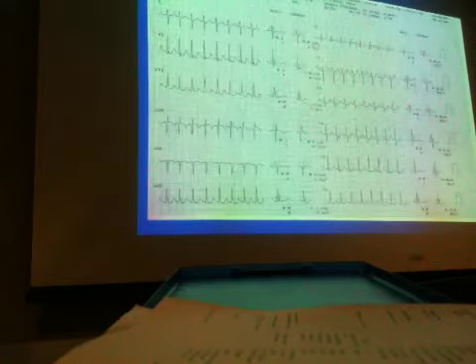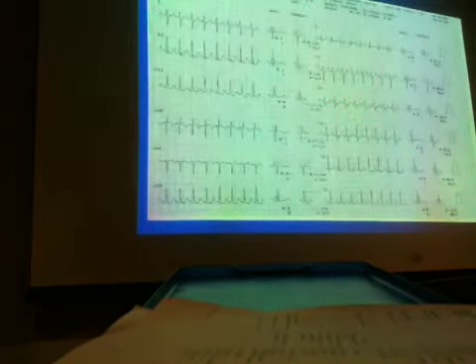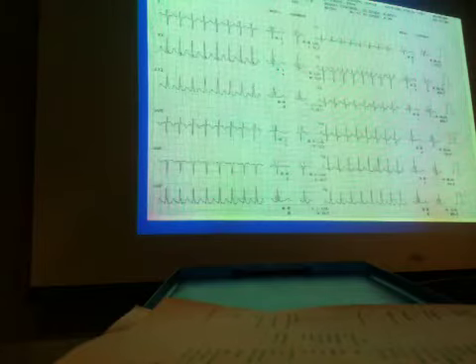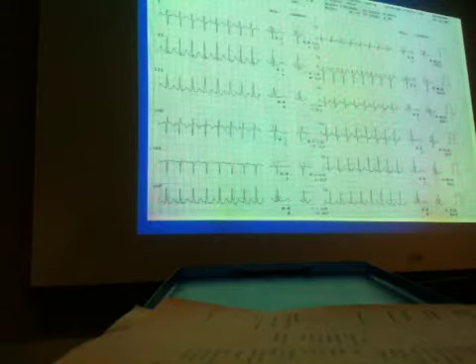So here's another example. So what is this? This was a stress test. The patient at first had some AFib on the treadmill. We stopped, let the patient sit down, and all of a sudden he does this. Heart rate is about 160, 169, it says up there. And I don't remember if he felt it. He just clocks away at 160, 170 beats a minute.